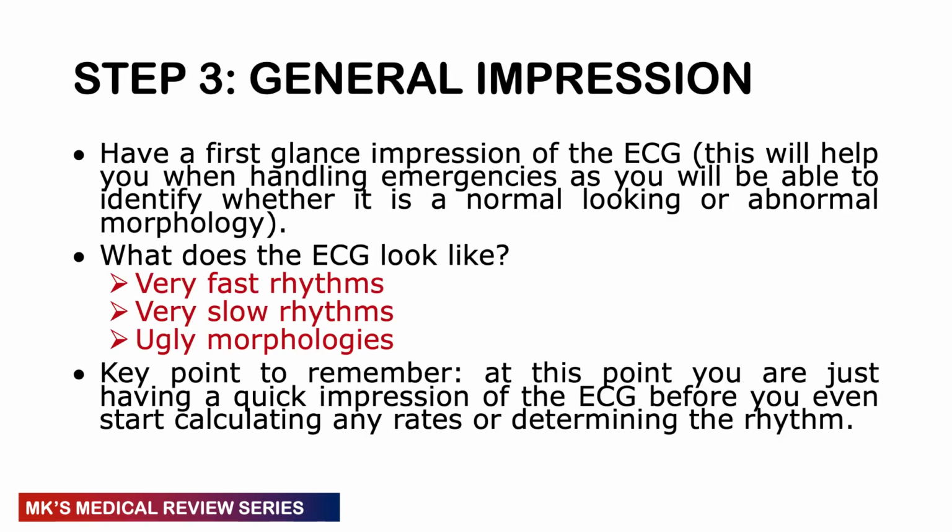So that's our step 2. Remember where we're coming from. Step 1, we're looking at the patient details, ECG details. Step 2, we're looking at the calibration of the ECG. Step 3, we're going to be looking at the general impression.